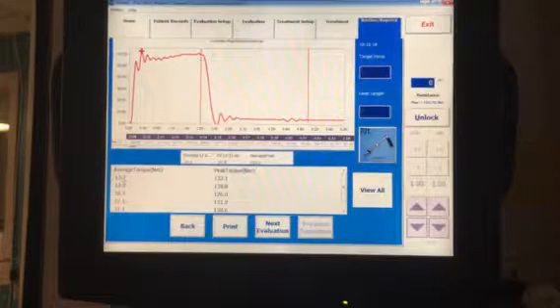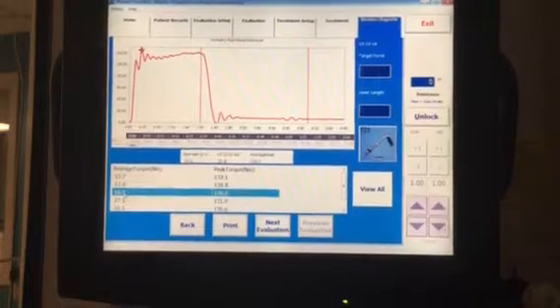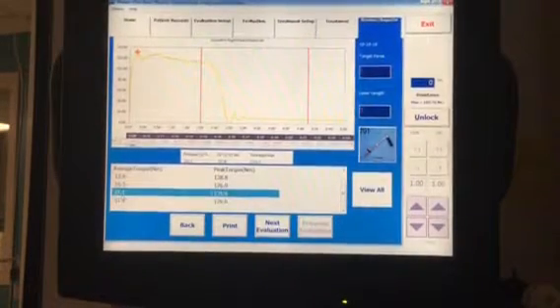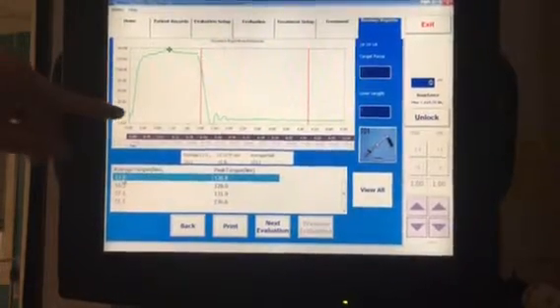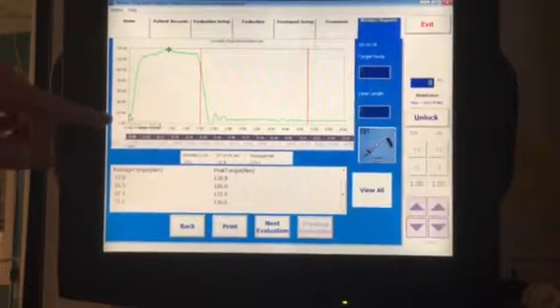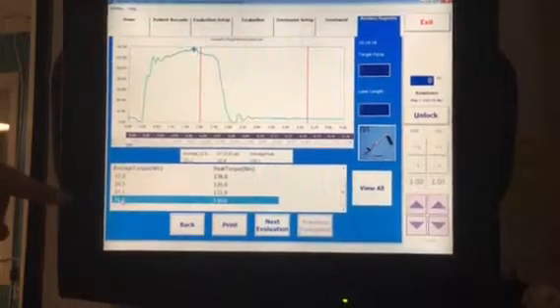Additionally, you'll have to look through the additional graphs and identify which ones are appropriate or meet the criteria. Remember that we're looking for the best 3. You're going to hit issues like this where this one can't be used because it doesn't start right at 0, so this trial would have to be thrown out and could not be used.